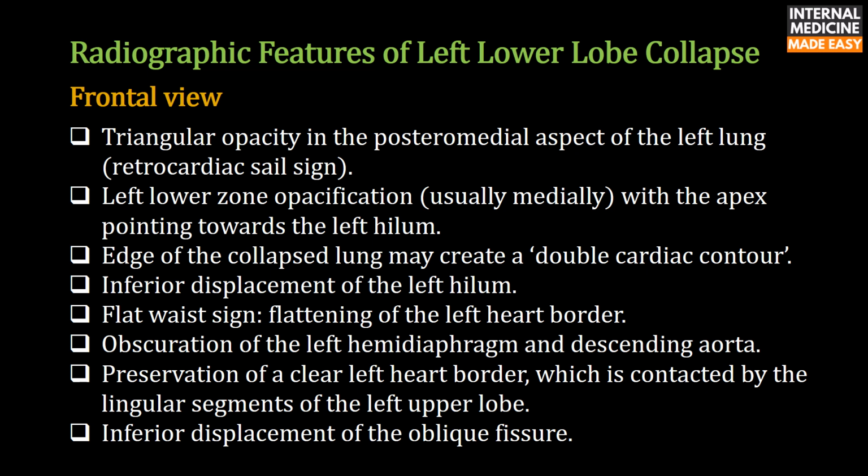Flat waist sign. Flattening of the left heart border. Obscuration of the left hemidiaphragm and descending aorta. Preservation of a clear left heart border which is contacted by the lingular segments of the left upper lobe. Inferior displacement of the oblique fissure.